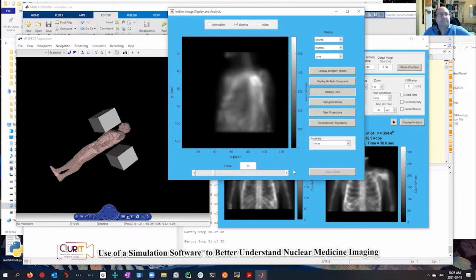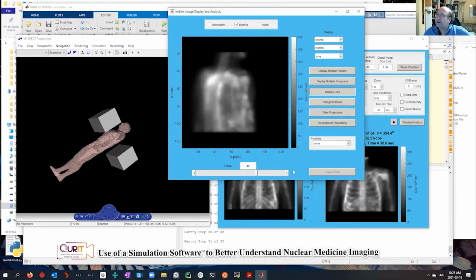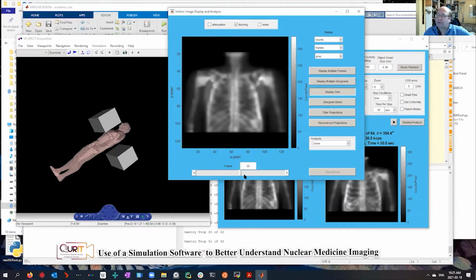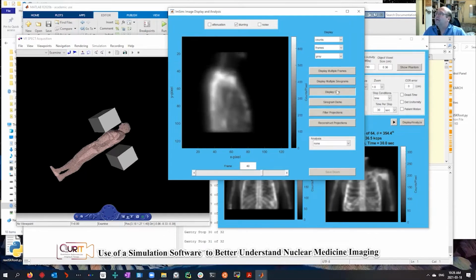like this. Now, this is not your PET MIP. This is just one frame after the other. It's not an image in the reconstructed sense. These are projection images as you're rotating around the patient. This is just one planar image. These are just planar images at different angles. Now, it sounds like you've learned about sinograms.